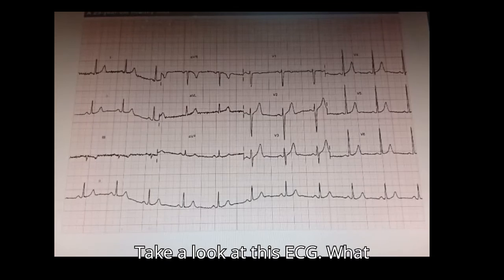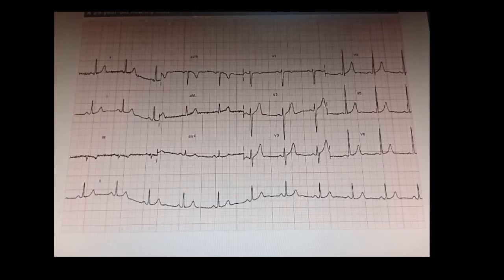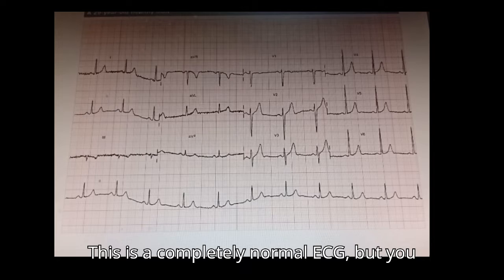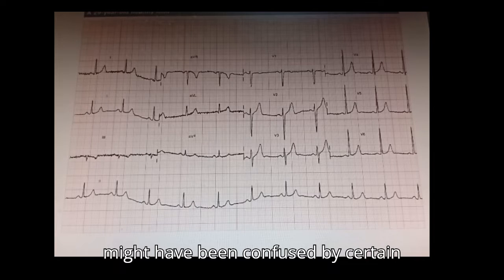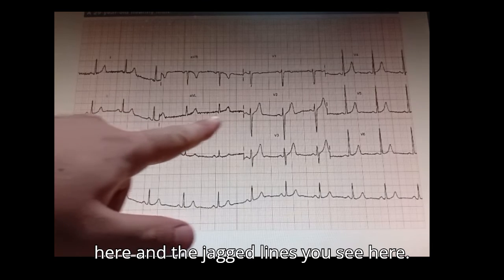Take a look at this ECG. What diagnosis would you make for this patient? This is a completely normal ECG, but you might have been confused by certain elements such as the downsloping over here and the jagged lines you see here.